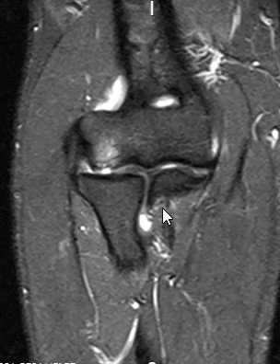Now, a lot of times we see these in the pediatric population. They're children who are athletes, and they have repetitive microtrauma, and they get a little piece of bone that dies, and it can sometimes be unstable or become displaced. This is an older person, and they had an injury of trauma to the capitellar articular surface. So in a younger person, I would call it osteochondritis dissecans, and in this patient, I would just call it an osteochondral defect associated with an old injury.